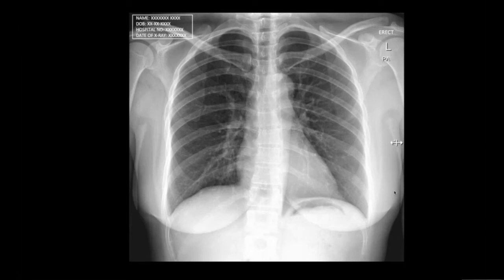Systematic review. There is no standard order of reviewing different areas of the chest radiograph. You can start from any part and have your own order of reviewing each area. Your approach may be different from other people. What is really important is that the review must be comprehensive and done in a systematic manner so that the risk of missing a pathology is avoided or minimized. The initial reviewing process may be led by what is most obvious on the chest radiograph or based on the clinical indication.